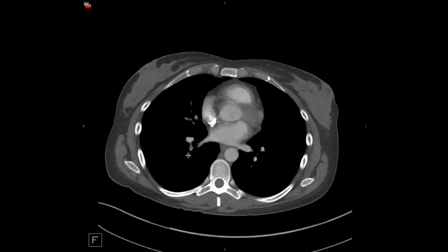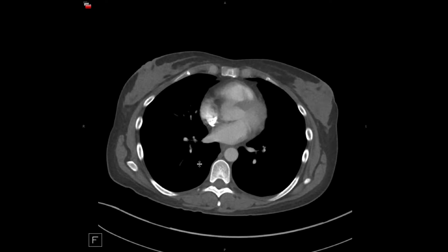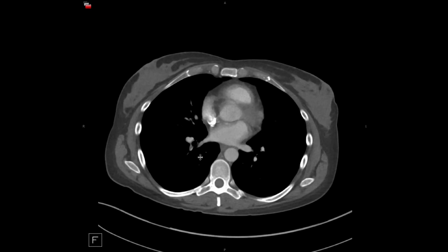It's small, so that is in contrast with acute PE, where the vessel size should be normal or maybe even slightly enlarged. Here the vessel has become small. This is because of the chronic pulmonary embolus that has just sort of caused contraction and scarring of the vessel. You can see that it's much smaller than these adjacent vessels at the same level.